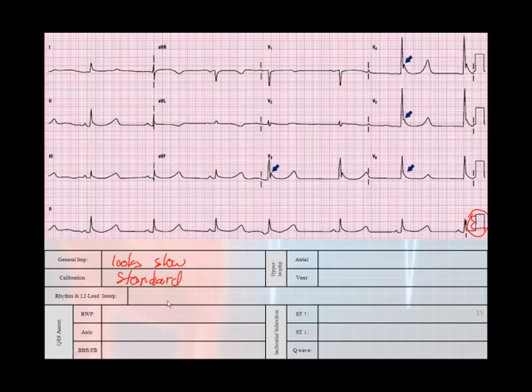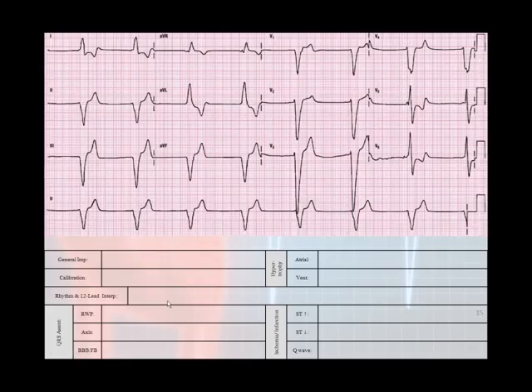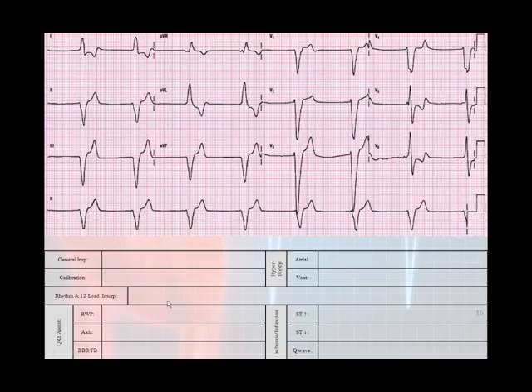Let's look at one more. It's going to be the same one that we had seen earlier, so let's go ahead and look at that real quick. As you glance at this, you want to say to yourself, is it excessively fast, excessively slow, or does it have ugly morphologies? Well, in this case, we have 2 problems, because if you glance at it, it looks slow, and it has ugly morphologies.